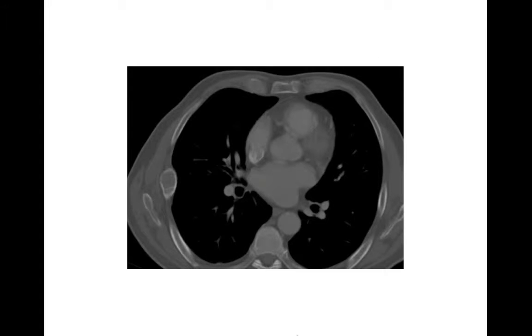I think those are the main things to consider here. Enchondromas usually aren't quite so expansile. There's no chondroid matrix in this case. It's possible you could throw it in there. That would probably be my limited differential for this case. This one turned out to be a brown tumor. They had multiple lesions throughout their skeleton, and they had a parathyroid adenoma causing hyperparathyroidism, which was causing all the brown tumors.